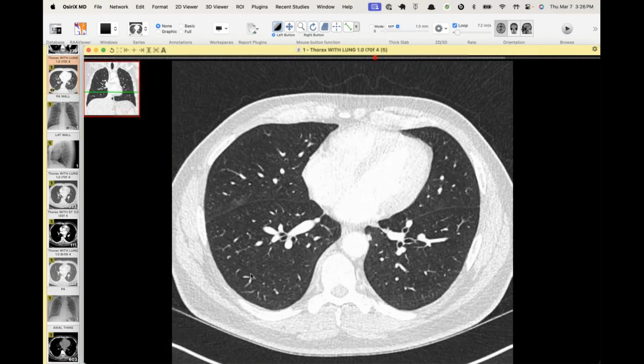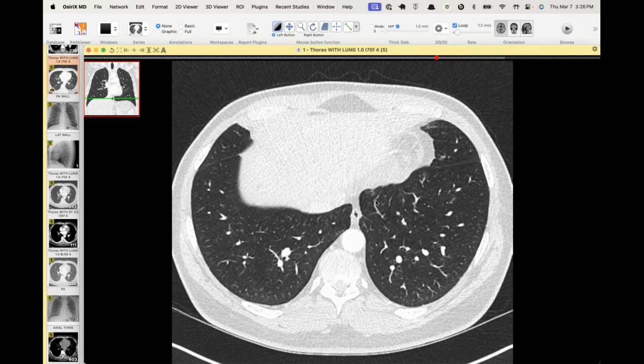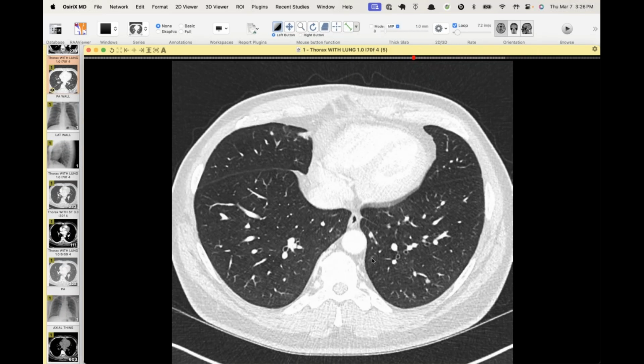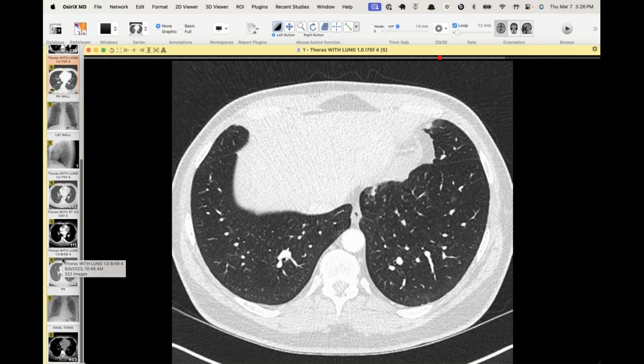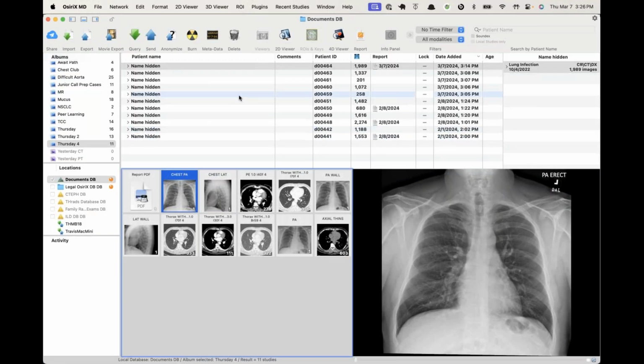I mean, yeah, Jeff, I agree. This doesn't really look, these are pretty discrete, solid, don't really look centrilobular aspiration. No, those don't, but that last scan you showed looked much better distribution. Sure. And of course, it's going to get better because it's going to clear anyway. And if there's any infection, it may have been covered anyway. Yeah. But yeah, the nodules don't fit with aspiration.